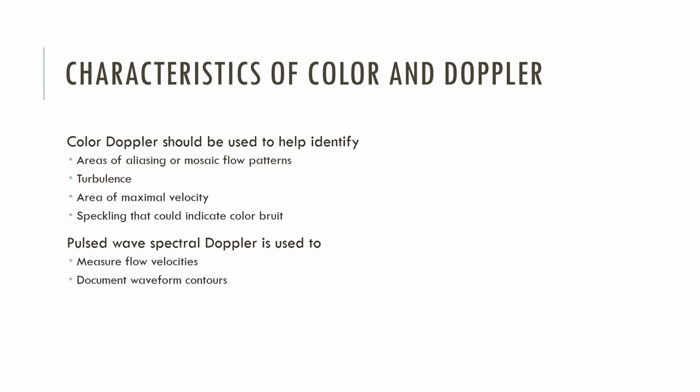Another thing that color Doppler can be really helpful in is demonstrating turbulence. So we know that if I have a vessel and there's a large stenosis in this vessel, as blood enters that stenosis, it's number one, going to flow faster because of that narrowed area, and the law of continuity tells us that the speed has to increase in order to move as much blood flow through an area, even though there's less space to do it in. Once it reaches the end of the stenosis, all of a sudden this blood has all kinds of room to move, and so we're going to start seeing some turbulent changes. That will be represented by what they call a mosaic, or a mixture of colors, because we're getting forward movement mixed with backward movement, reds with blues, and so on and so forth.